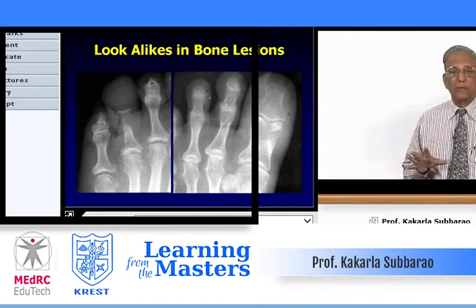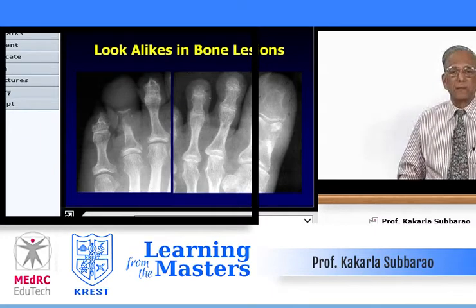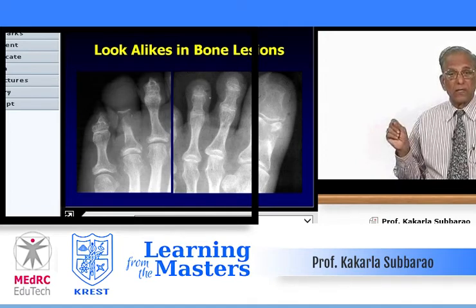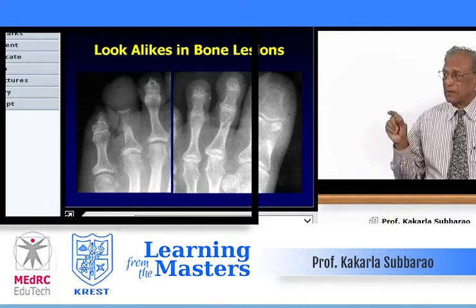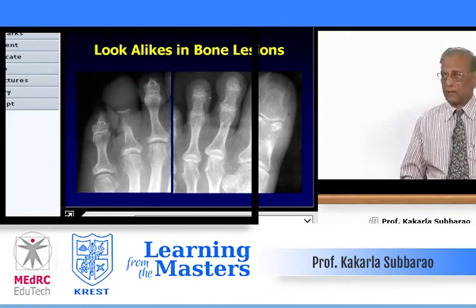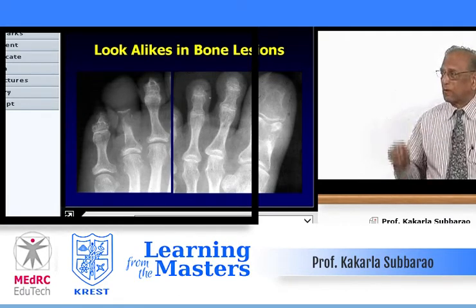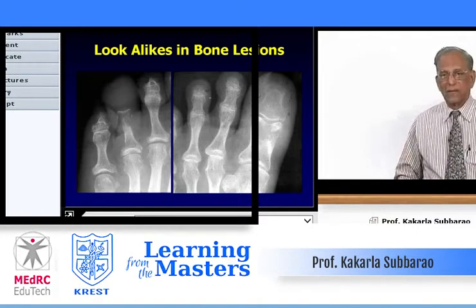And it's again gout. It is so severe, the distal phalanx has completely disappeared, but the soft tissue swelling is there, although there are no calcific foci to indicate that there are tophi, but then it is lytic and it is involving two bones. An adult, you think of gout. Could be osteomyelitis. Yes, it could be, except there is no periosteal reaction.